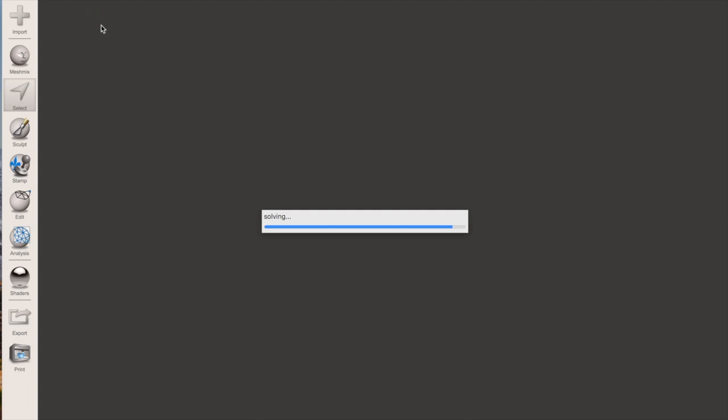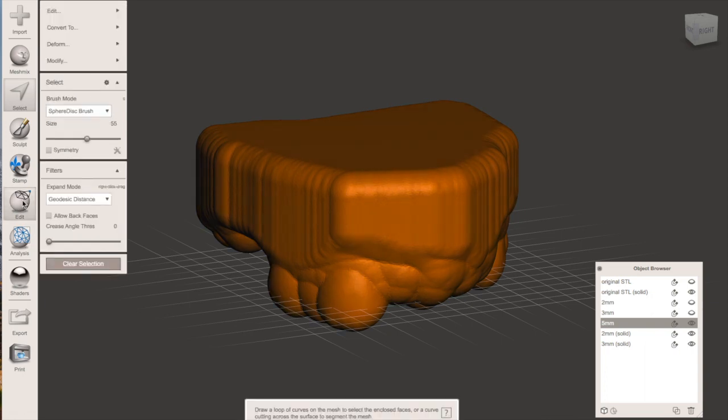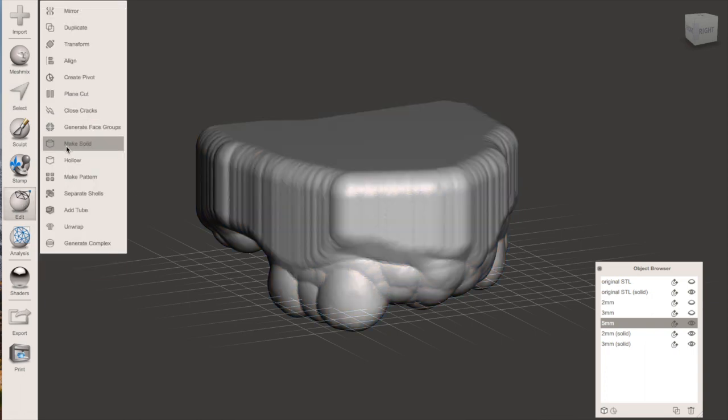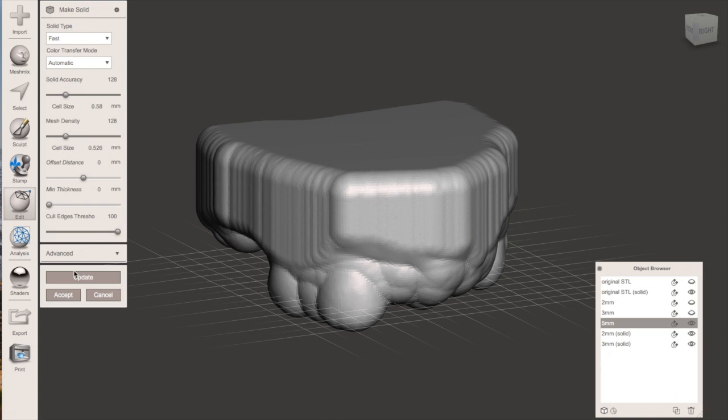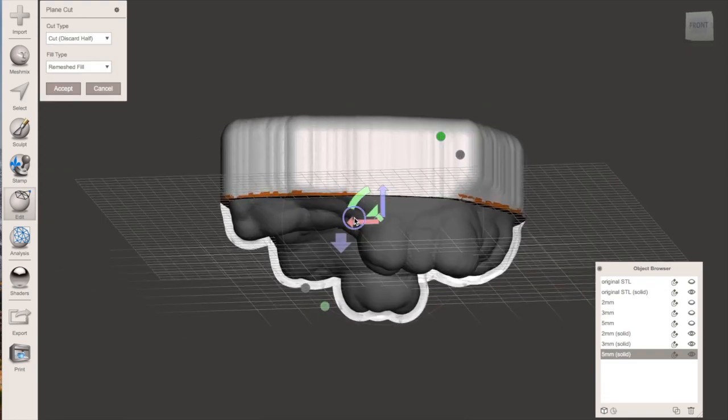Now if you don't need the palate, you don't need as thick or as high a plane cut. It just depends on the purpose that you're using the tray for. If you're using the tray for a denture impression, you obviously need the whole palate. If you're just using the tray to pick up implant impression copings or impression posts, then you probably only need the teeth component. So make that plane cut wherever you need to suit the purposes that you're using the tray for.